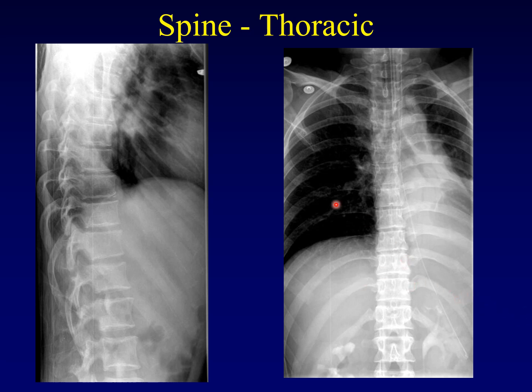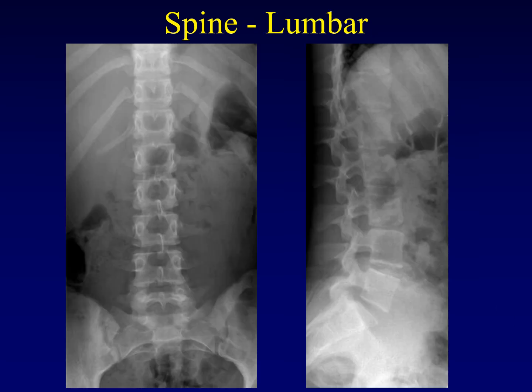Remember the attachment of the ribs as in previous lectures. Now, when we get to the lumbar spine, we've gone back to a lordotic curvature, right? There's a normal lordosis to the lumbar spine. The apex of the curvature is anterior, ventral. And here again, the vertebral bodies are shaped like rectangles when seen in this projection.